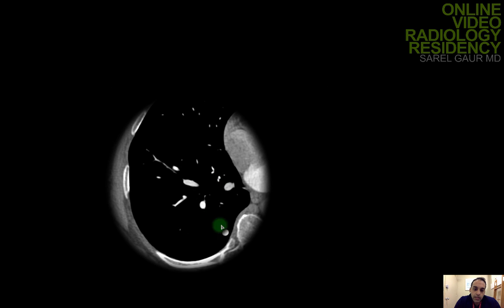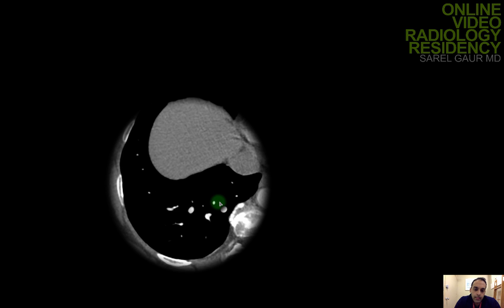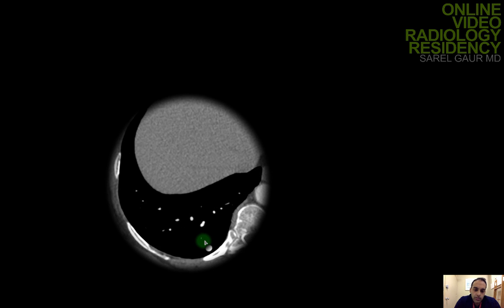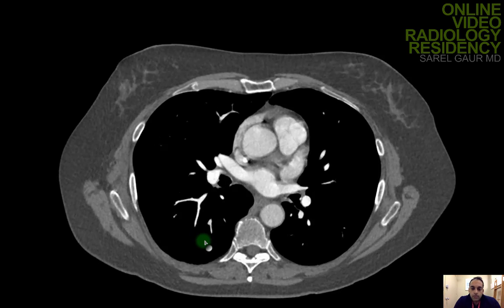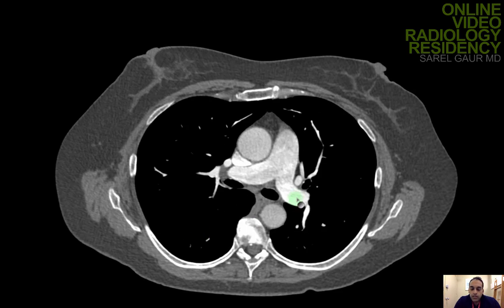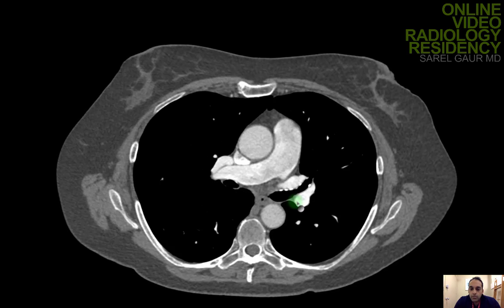And now I'm just widening my eye again, looking in this whole section of lung, looking for any thrombi. So you can see that the contrast flows all the way out to the base. So there's no pulmonary embolus. So now I back up, do the same thing on the left. So here I am at the left main pulmonary artery. I'm going to come up and try to do the left upper lobe.